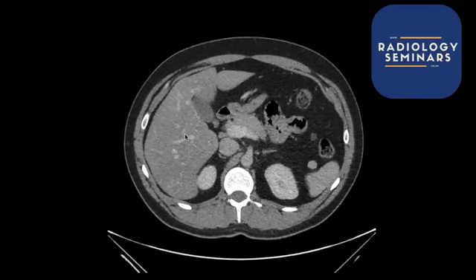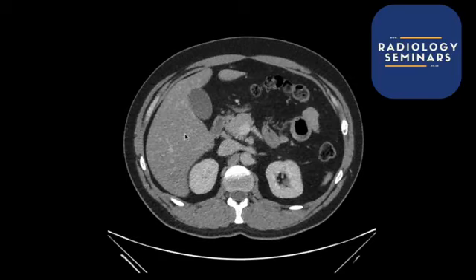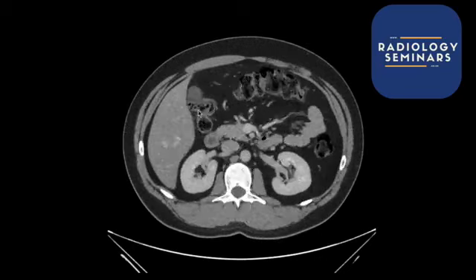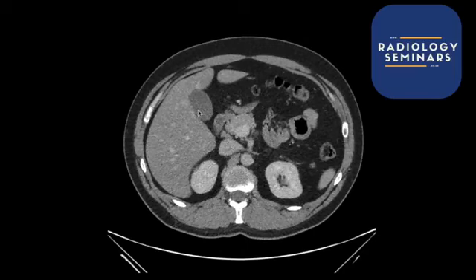And if you really want to be very, very accurate, go on the internet, look for the diagram, and you'll find it. Okay, so next thing we've got the gallbladder. Very important to look at the gallbladder. A lot of pathology can happen there. No doubt most of you are aware that if someone has gallstones, they could have inflammation in that gallbladder. That gallbladder can perforate. There's all sorts of things that can happen when you've got inflammation or some pathology with regards to the gallbladder.